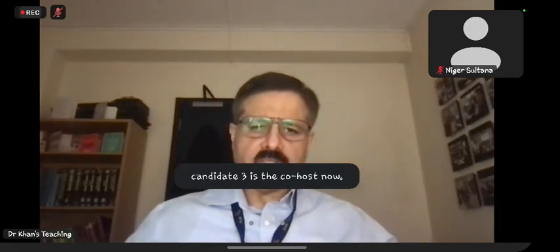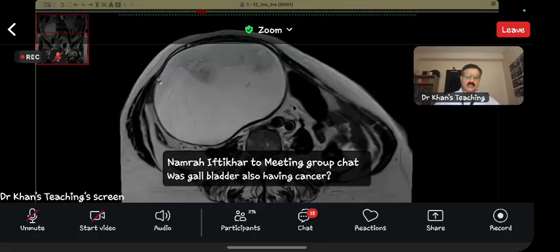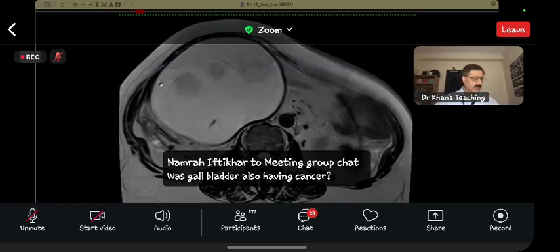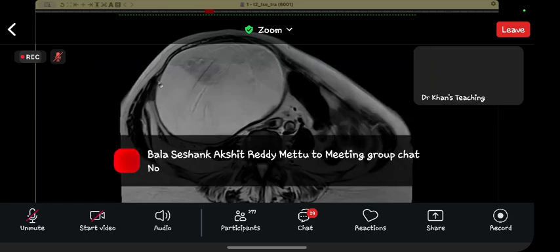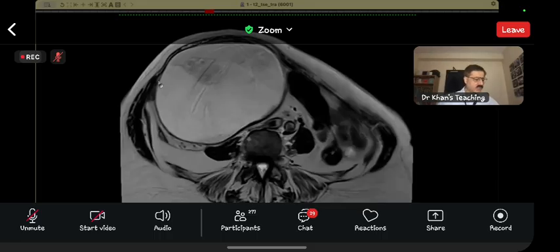So your first case is this one. If you can listen to the history. Candidate 3, you are listening? Yes, sir. Okay, so this patient had an ultrasound in which they picked up a large mass, and they asked for an MR. They said possible ovarian mass. Over to you.